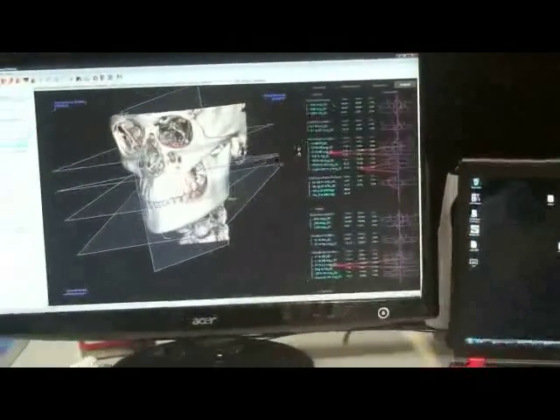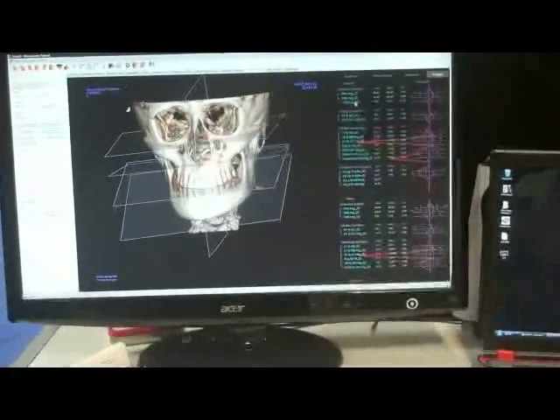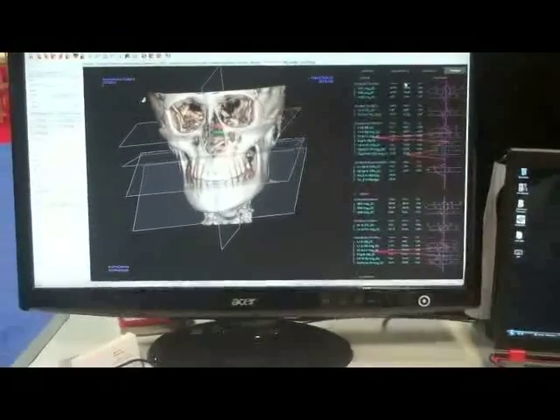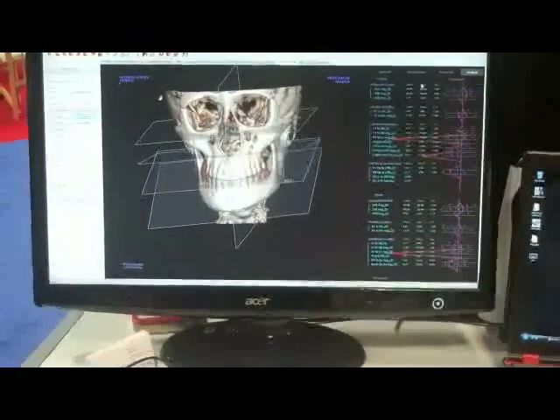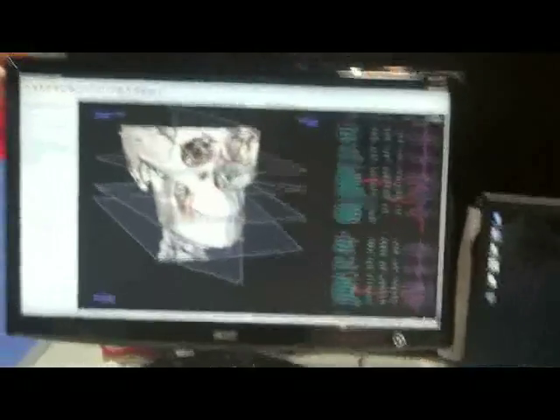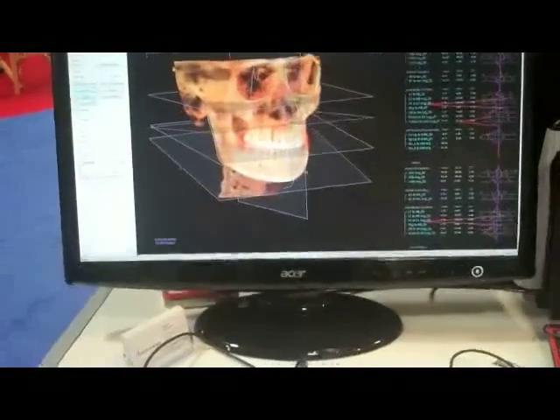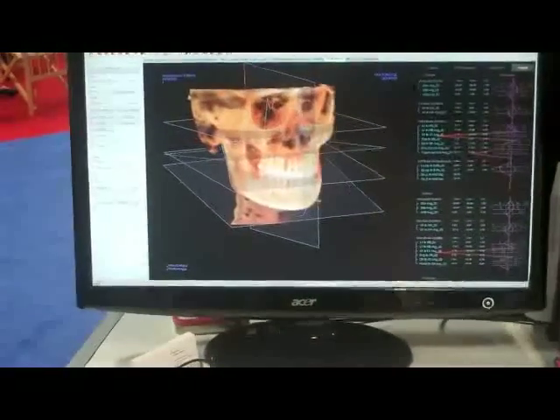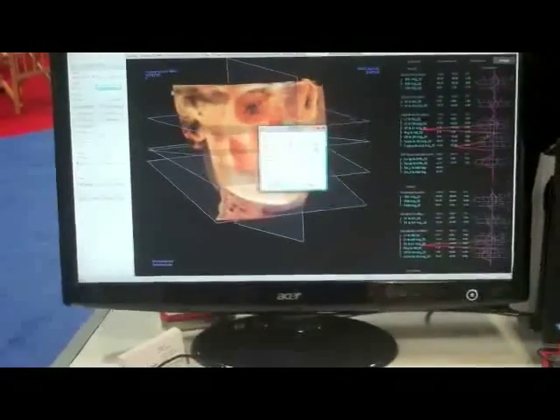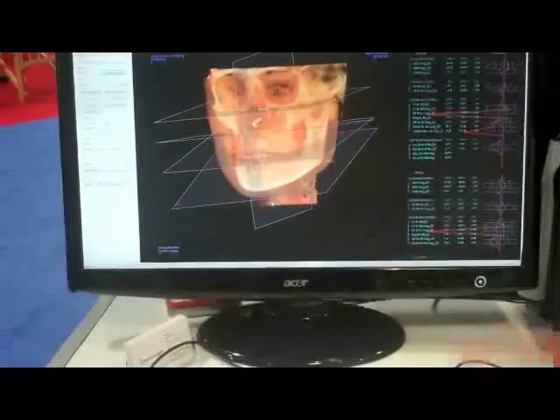Here's your analysis. Obviously a couple of little things are off right now because I didn't do it right, but we'll be able to do any kind of default analysis or custom analysis. You can create your own landmarks, your own measurements, your own reference lines or planes, as well as your own analysis. The other really big thing is you can incorporate the Anatomodel right into here. The digital modeling service that we do, we can incorporate that right into the analysis. So maybe I want to turn my skin opacity up, right? And so now I can include direct patient information in there.